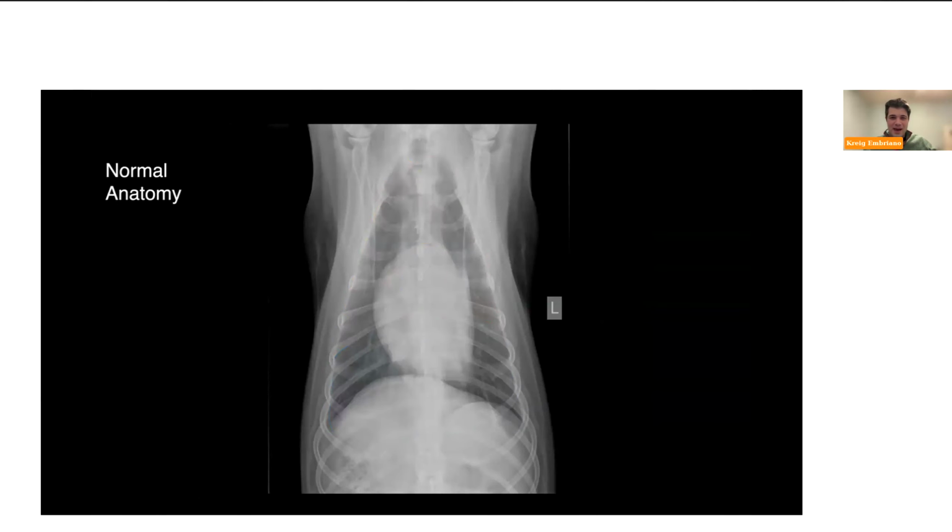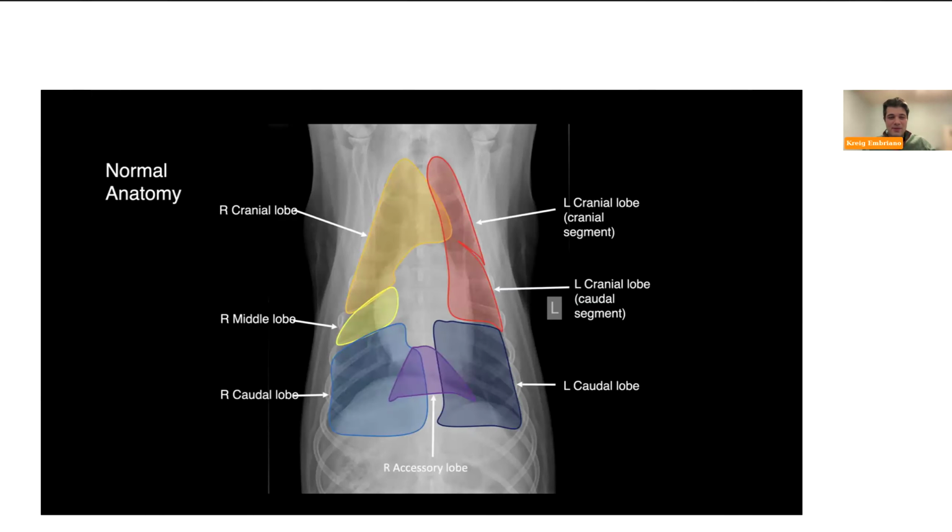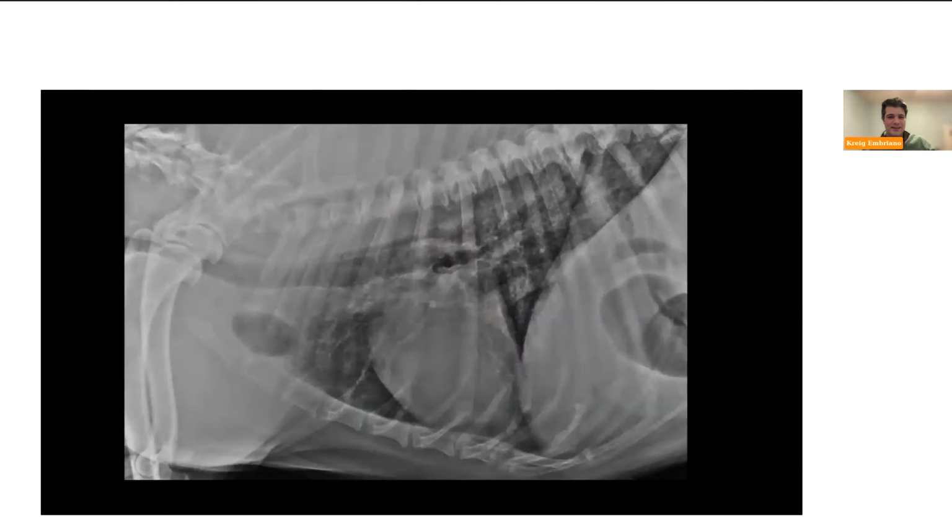And as we go back to this image here, you can kind of see the soft tissue line and that's the cranial-mediastinal reflection. And that'll be more or less conspicuous depending on the patient, how much fat they have in their mediastinum. But that's because of this protrusion. Okay. And that's important because I often get emails, texts, and addendum requests asking what this is.